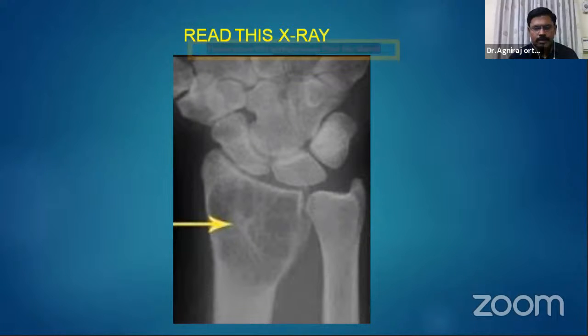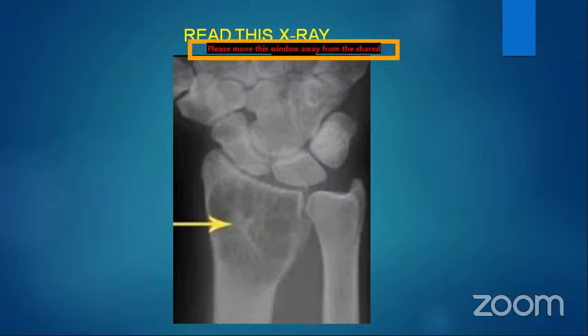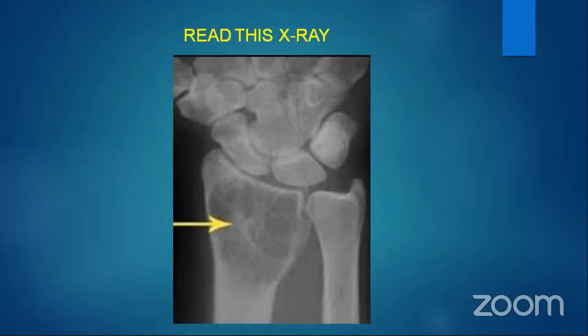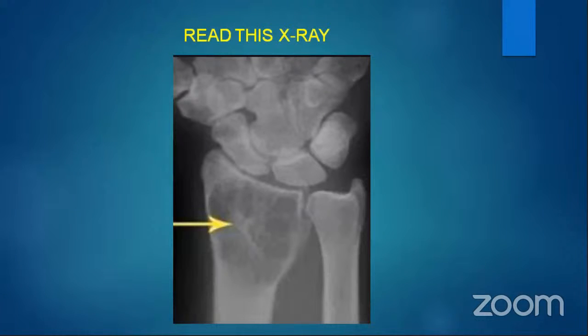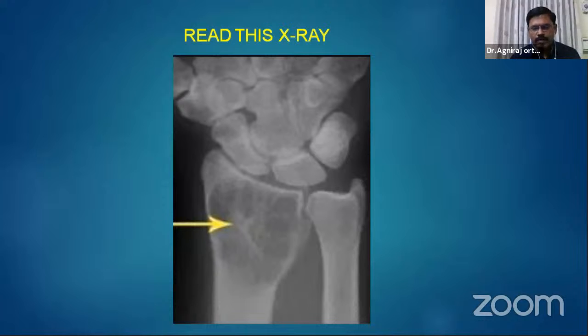Okay. Then what else do you want to say? You were told about the skeletal. Comment about the zone of transition. I don't know how to comment about the zone of transition, sir. You don't know whether it is narrow or wide. You don't know. Okay.